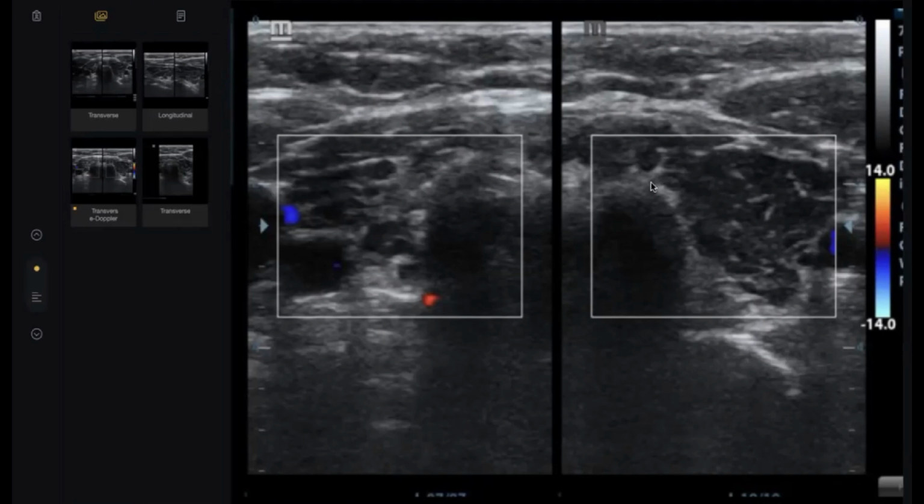Sir, I was asking that in thyroiditis we usually get increased blood flow. Yes, this is maybe post-thyroiditis. Okay, I answered falsely. But at least what I'm telling now is about the technique, describing. Very good, very excellent. But before management, tell the examiner about your differential. This is very important. It is better to say post-thyroiditis. This is the correct term.